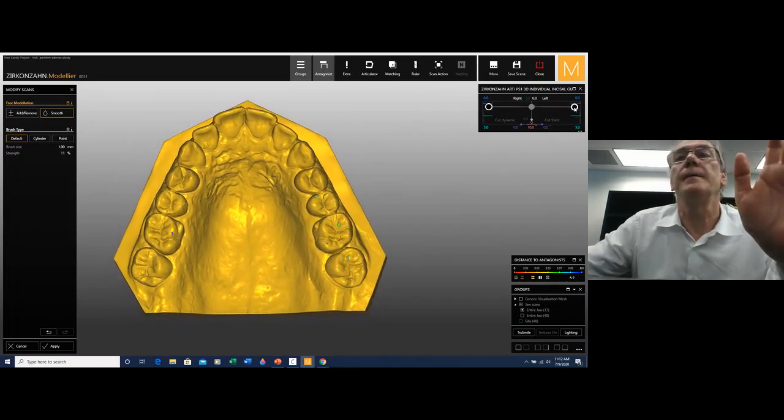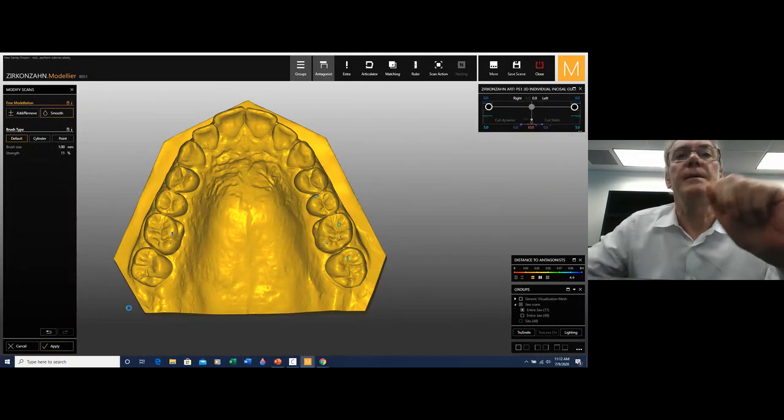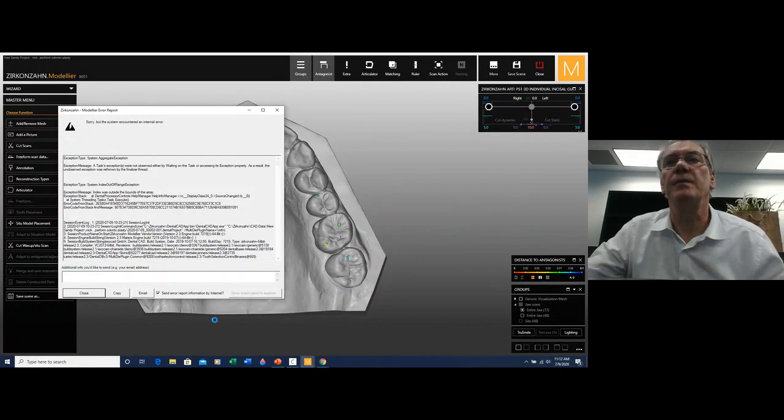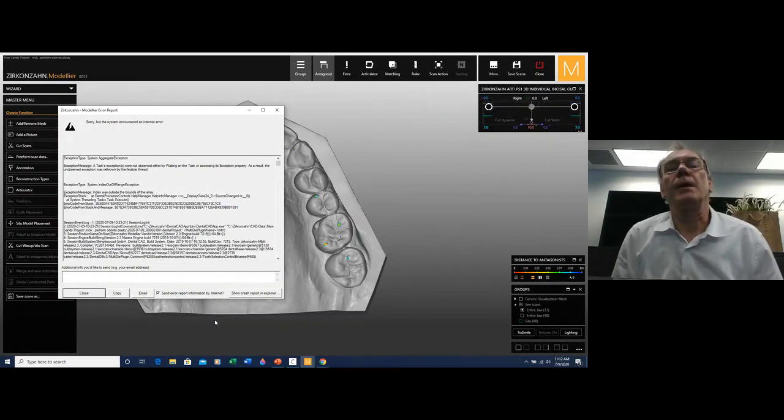I believe that I am through with everything. And I will say apply. Take note of all the touchings that have been performed. Create a sort of a map. Doctor will take care of those touchings directly in the patient's mouth, and then from there, go ahead and establish the second part of the therapy.